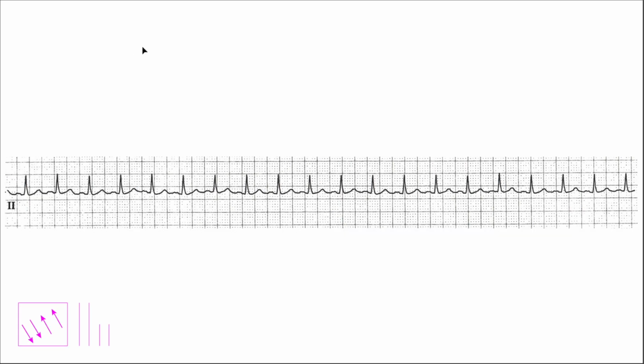Okie dokie. So, single channel, coming from lead 2, 10 seconds long. The only thing you can reliably do here is pull rate and rhythm. When we talk about rate, typically people are talking about ventricular rate, which is good. The ventricles push the blood into the system, so your ventricular rate tends to be the most important one. However, it is a trick question. When somebody tells you, give me the rate, or what is the rate, your response should be: the rate of what?